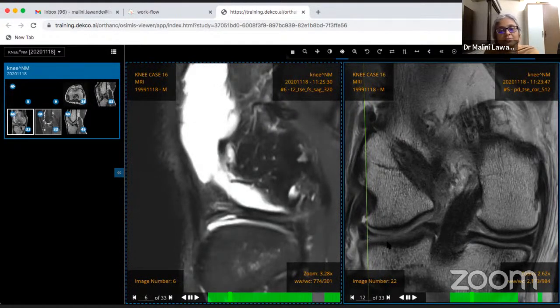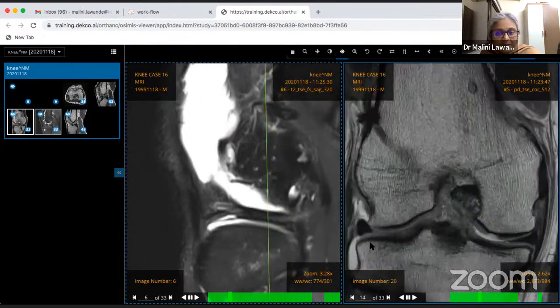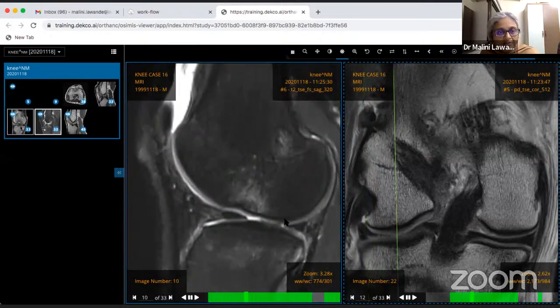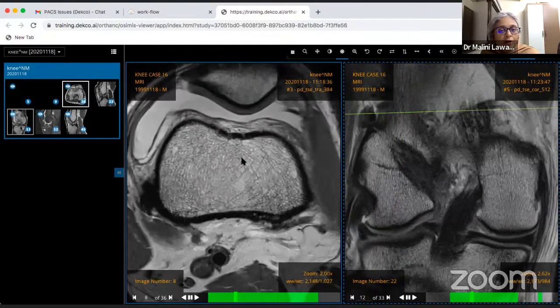So to distinguish between a meniscus where a partial meniscectomy has been done or if a repair has been done, you can have abnormal shape of the meniscus, obviously. You may see some bright signal or defect, but remember, if it's not fluid intensity, if there is no displaced flap, it is just post-operative change. Again, this effusion is just because of the trauma.